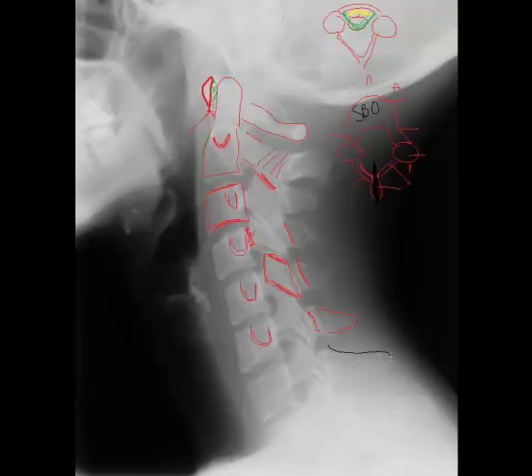And lastly, spinous process. Now there are other things that you can see on cervical radiographs, lateral projection, specifically prevertebral soft tissues. All this gray that is anterior to the vertebral bodies is actually the prevertebral soft tissue, and it's named for the airspace that lives in front of it. This tissue is important, especially in traumatic situations where there has been damage to the osseous structures or even the soft tissue. This region will distend. Here's the airway, here's the mandibular angle, and of course you can see portions of the skull and of the face.